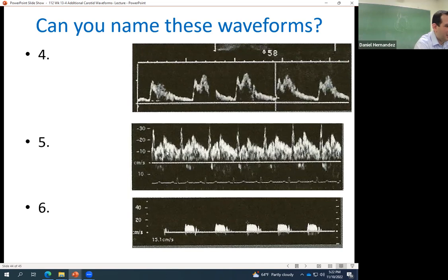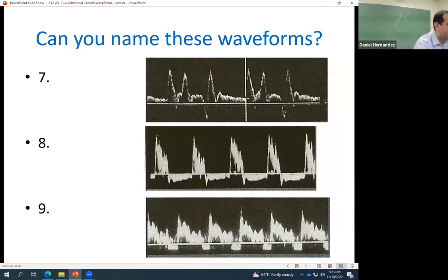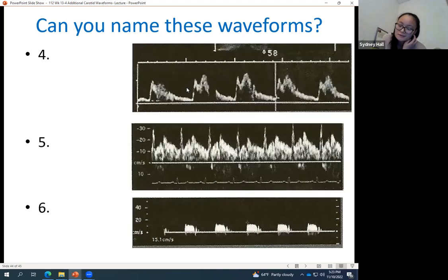So this is a vertebral artery now. This looks like a crouching bunny. Crouching bunny, yeah. So this is subclavian steal. And then that last one's the proximal thumping, right? The thumping, yep. I'm still drawing my crouching bunny for the subclavian steal. Yes, I'm drawing them so it's easy to remember.